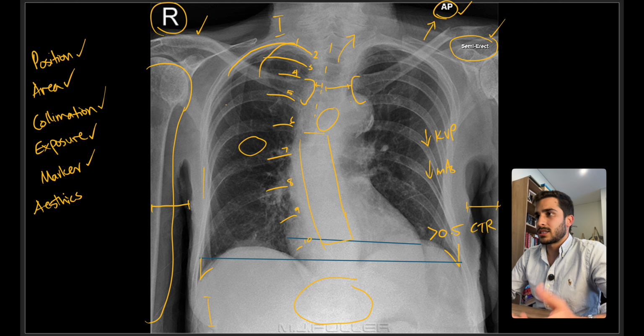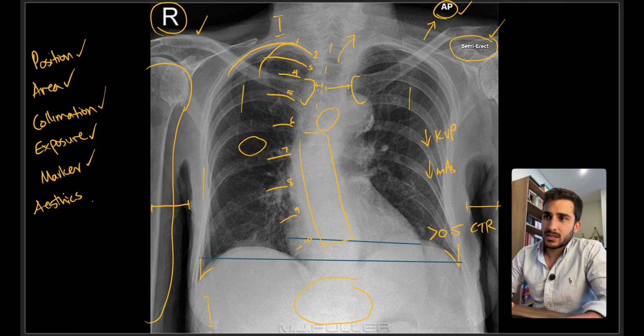Okay. How does the image look overall? Not the best, right? So the exposure is kind of off. It looks very contrasty. The noise levels could improve. The patient's arm is in the way. The scapula is sort of not removed from the image, and overall not the best aesthetic. Now in terms of the artifact, there doesn't seem to be any artifacts in this case. Okay, by the way, this is the aortic knuckle, so that's just the aorta coming down, and we have the hilar region in these areas, and then the ribs and the lung architecture itself.